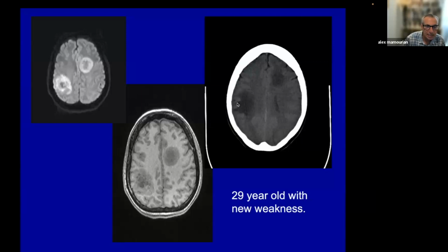This is the CT scan of the patient. Actually, it started out as a stroke alert. CT was done first, followed by MR. So before you spin off into any sort of differential about a case like this and trying to establish a diagnosis of, say, multicentric glioma and such, you want to at least consider demyelinating disease.